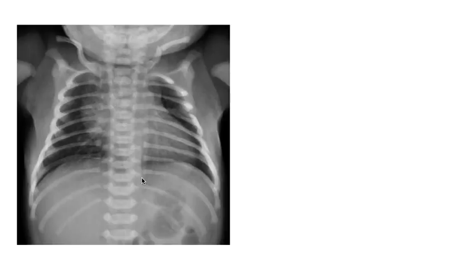What is in this X-ray? What appears to be abnormal? So you can pause the video, take your time. Somebody may think that it may be apparent mediastinal widening, but again it's an infantile X-ray, so this is nothing but the thymic shadow. So 1, 2, 3, 4, 5. So not an expiratory film. 5 to 7 is okay with us.